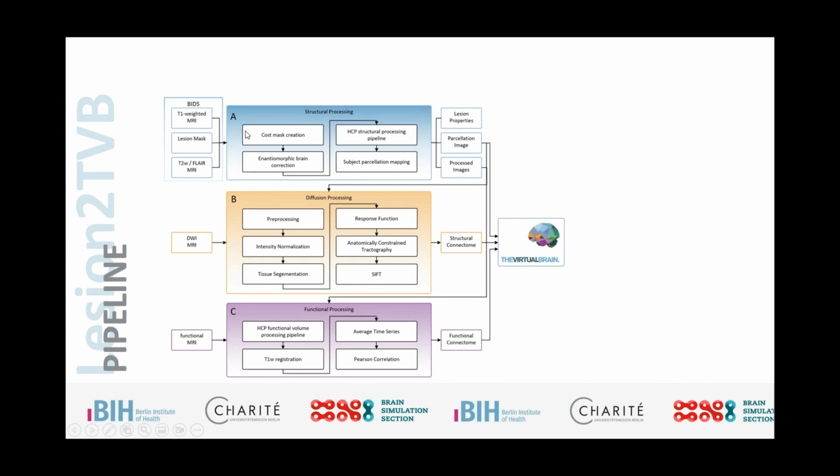So as we mentioned in the cost function masking, we need the mask to exclude the lesion signal, and we are registering all over the place all the different modalities that we have iteratively. So in the first step, we're taking this lesion mask and creating those masks in the different spaces by registering, already using this mask, the original image that it is based on, like I said, FLAIR or T1, and registering it to the different spaces, even to MNI, because this is needed as well.